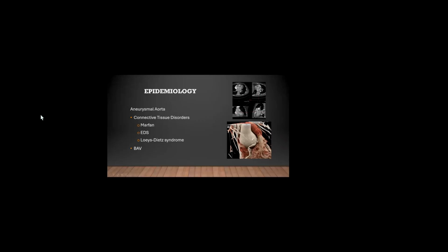So that is the non-coronary sinus. We know that the aortic valve should be tricuspid, but in this case, the right and the left coronary cusps are fused together. That leads to the helical flow, which starts putting pressure at certain points in the aorta, dilating it, and the wall becomes weaker and more prone and liable to be dissected.